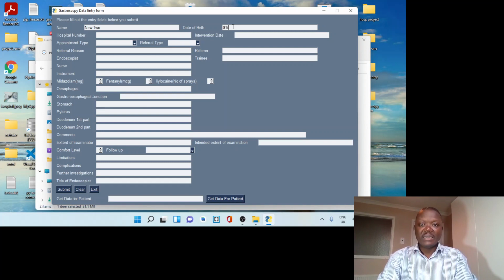Date of birth 1st of 12, 1980, hospital number 20,001, and intervention date, let's imagine it was just recently done, a type of urgent referral type, inpatient perhaps, reason for referral, melena, passing blood, referral Dr. A, Dr. B is the endoscopist, no trainee was present, nurse C was there, instrument GIF 12, sedation was used, let's imagine 2, and then fentanyl was 50.